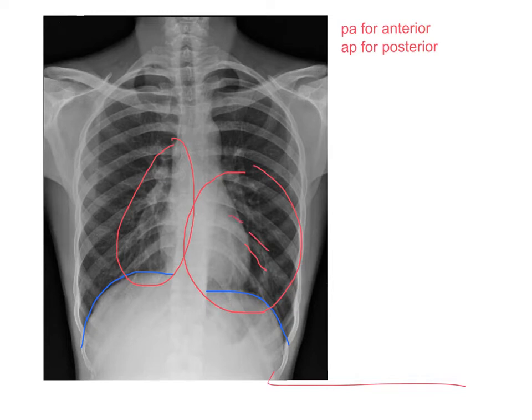We could still see them, we could still outline them, but we're starting to lose some of that detail when we get into the middle of the heart shadow and these lung markings, especially right through here and here and here and this rib as well. We don't really care about anything down here because this is an above diaphragm PA projection. We would get more of this when we do our below diaphragm ribs.